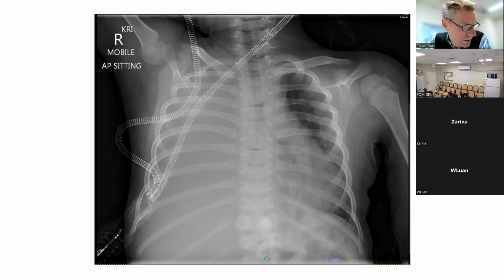Like, what are you thinking about? Thinking more like fluid or something solid that could be taking up space, causing the shift of the midline. Yeah, very good. You've jumped a step already, which is good. You thought about it being fluid or being a mass, some solid structure. Of course, if you see a homogeneous opacity, then there's four things conceptually it could be, isn't it? It could be consolidation, effusion, collapse, or a mass.